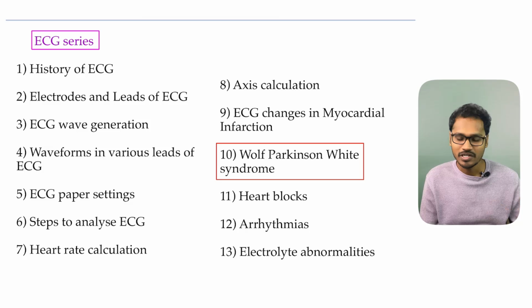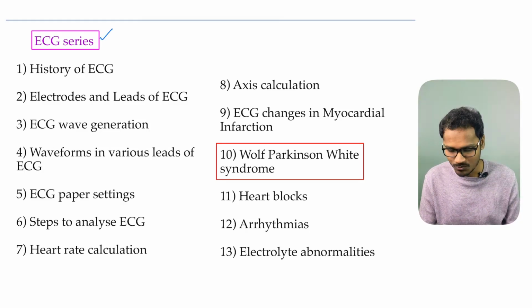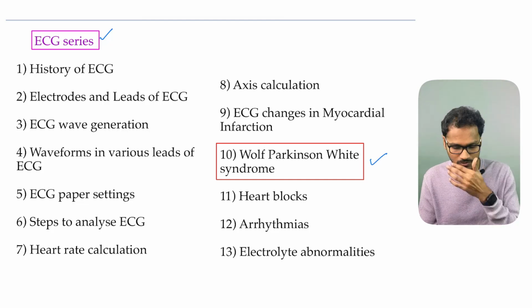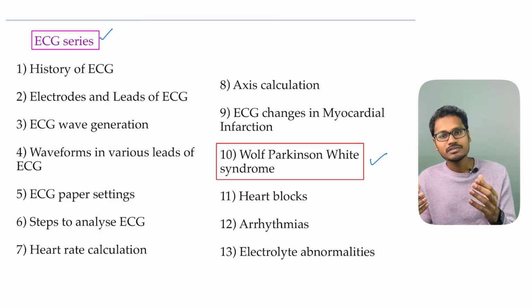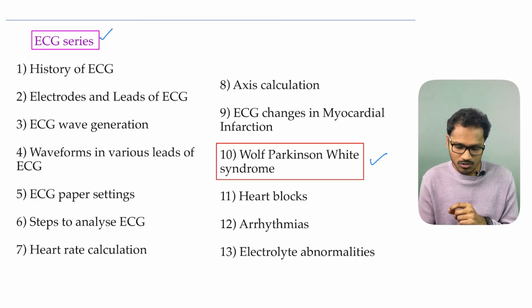Today we are going to continue with our ECG series, and in this video we are going to understand what are the ECG findings in Wolf-Parkinson-White syndrome. This is not a very common syndrome, but sometimes the findings in the ECG are so classical that they can be asked in multiple choice questions. So that is why this topic is important.